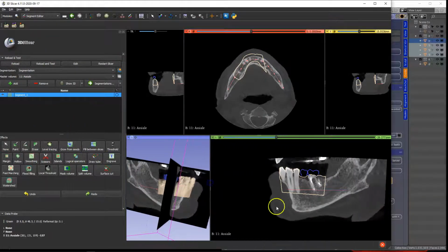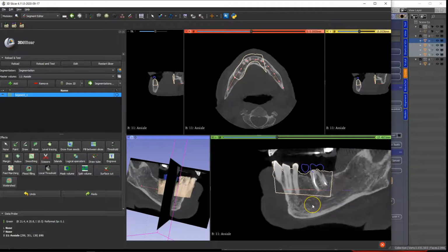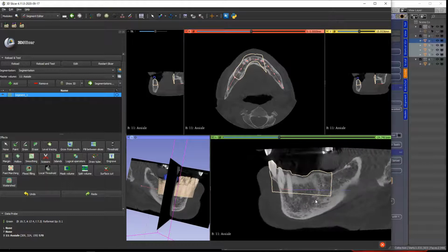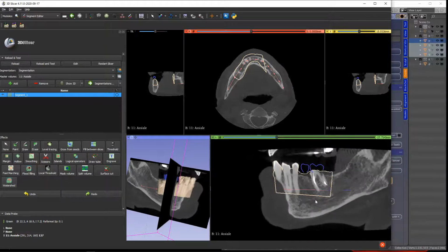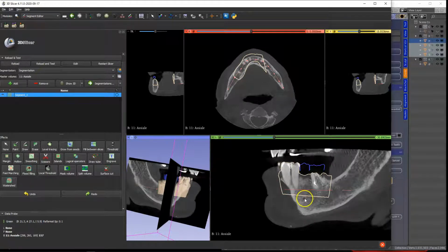Now it's important that you get a good visual of this first so that you can see how it runs along and where it exits as well. So with the mouse wheel, just simply scroll. Here we go, over here. Draw tube.